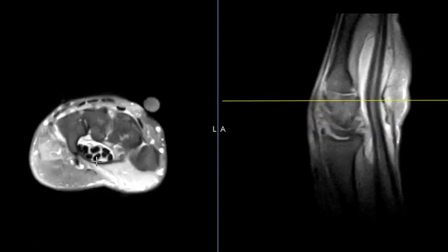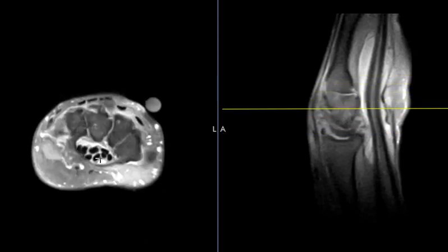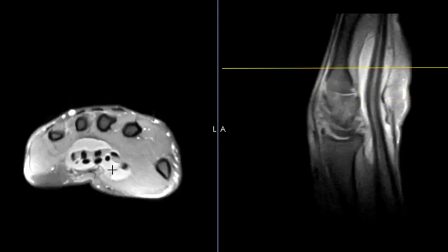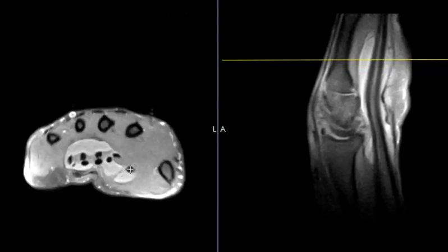And as we go here more distally, it goes through the carpal tunnel, which is right here. And distally, we see this balloon out, these 2 fluid collections, 1, 2. And again, this fluid collection will go around the flexor tendon to the thumb. This will go around the flexor tendon to the fifth digit. And these 1, 2, 3 fingers here, they have flexor tendon sheaths that are usually separate from this.